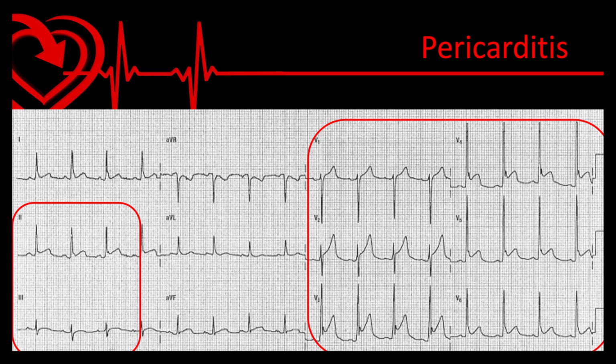You would look at this and potentially think this is a huge septal, anterior, lateral, and inferior infarct. Not a very common occurrence to have all of those areas infarcting at the same time, but more importantly, the story isn't going to fit. We look a little closer and you can see that in that lead, you even have that little fishhook appearance. It's a funny looking ST elevation, not the type of elevation you typically would see with an MI.